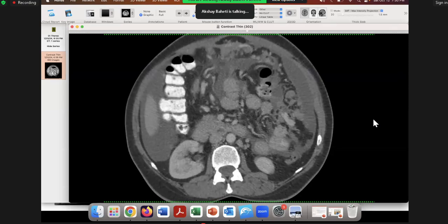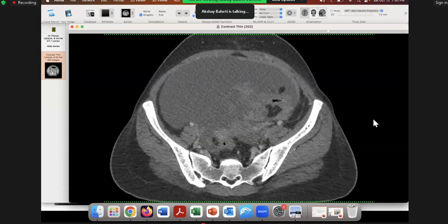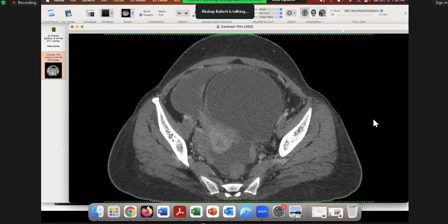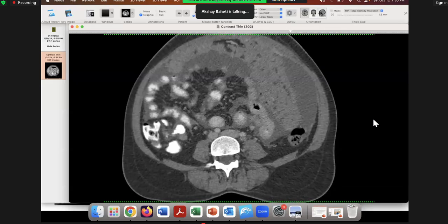Okay, so technically pelvic nodes, iliac nodes are not something you expect. They can, of course, happen. As I said, ovaries can go to all nodes. But generally, the first thing will be RP nodes, retroperitoneal nodes. Okay. So here you're seeing some suspicious RP nodes. Maybe there's something here, right? You see this common iliac node here.